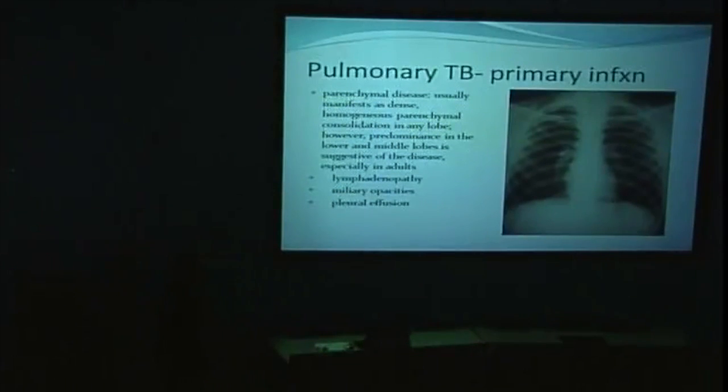Primary infection, as you probably know, is maybe a subclinical illness, may present with not much going on there. Patchy airspace consolidation, looks like a bacterial pneumonia very often, and heals often with a residual calcific density, known as the Ghon focus. You often get associated lymph node enlargement in primary TB, and when these hilar lymph nodes calcify, it's called the Ranke complex. It's commonly lymphadenopathy involved.